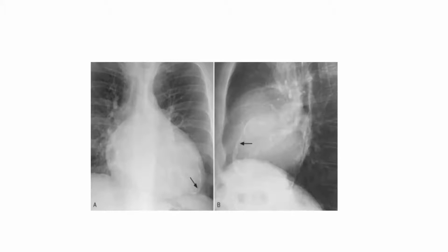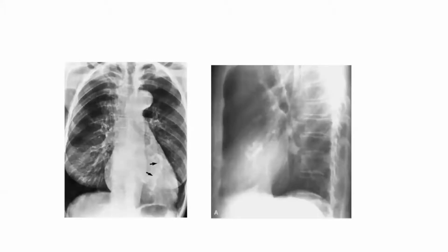Okay, so now I'm showing you different calcification densities in the chest X-ray. I'm trying to get you to the art of seeing, or guessing, which is which. Now, what is this? Again, we have seen an example of it. This is a curvilinear density in the location of the mitral valve. So this is again MAC. And if you draw a line from the hilum toward the costophrenic angle, the valve below this line is the mitral valve. Above this line is the aortic valve.